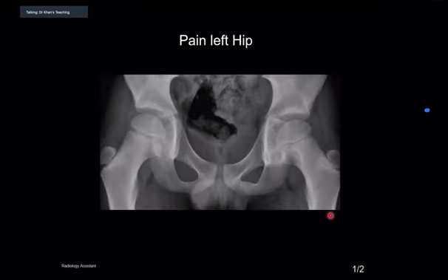Look here, there is another case with a similar finding. If you see here, lucency here, and it is very difficult if you are not very careful, because there is a lucency, but then you realize that there is a bit of sclerosis. And the fat plane, look at this capsular fat plane, and you will agree that as compared to this one, it has slightly distended.